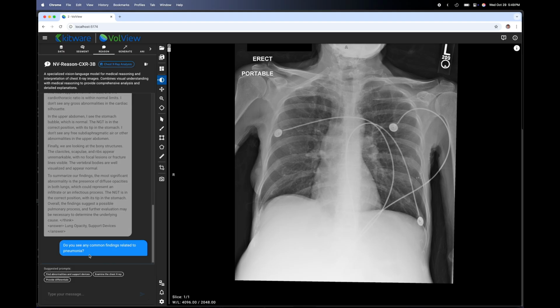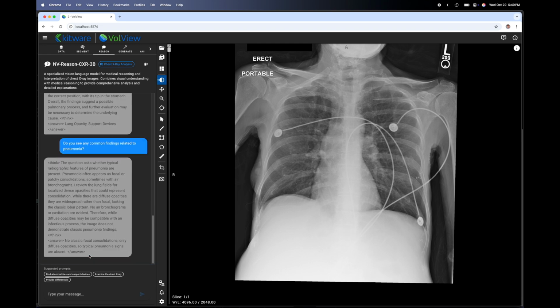As a smart assistant, it should recognize whether there is a match or mismatch and provide me with context that guides my understanding. And as you can see, it's able to answer my general medical question about the chest X-ray. This can provide invaluable feedback and understanding to a clinician or even non-clinicians as they gain an understanding of the case.